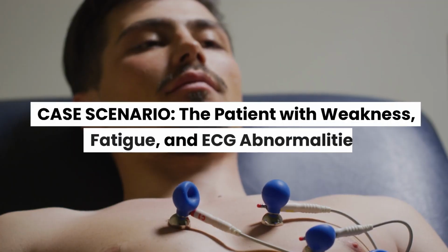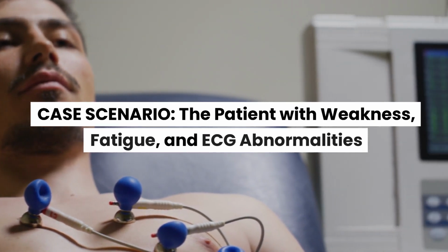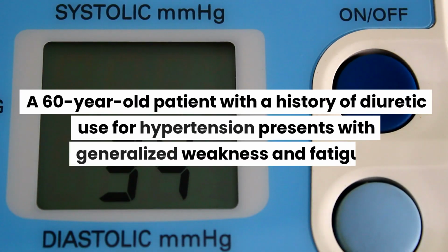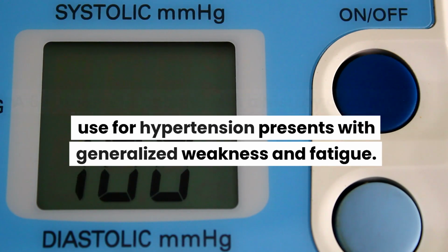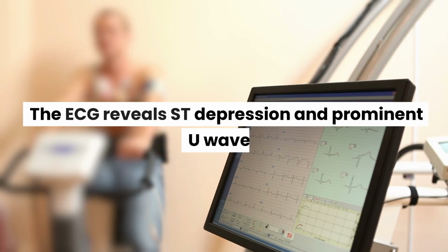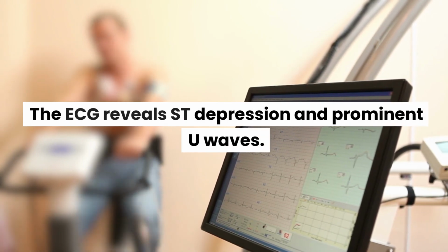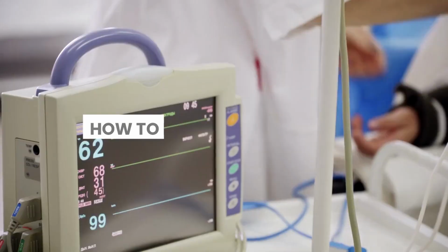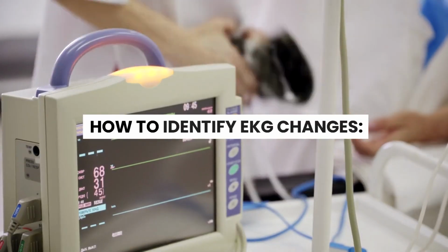Case scenario: the patient with weakness, fatigue, and ECG abnormalities. A 60-year-old patient with a history of diuretic use for hypertension presents with generalized weakness and fatigue. The ECG reveals ST depression and prominent U waves. Lab tests confirm hypokalemia. How to identify EKG changes?